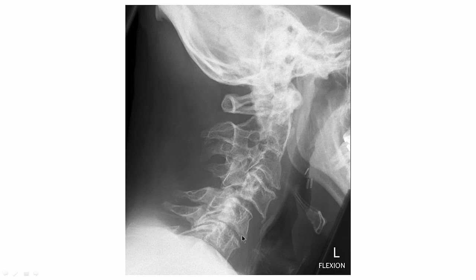Let's do the anterior longitudinal line. So that would be running up smoothly. Oops, what happened here? That doesn't look very smooth, does it? No, this is way too far forward. This is called the anterolisthesis. You could call it a spondylolisthesis as well. Grade 1, and that's not good in the neck, right? Because the spinal cord sits right back here. This can kill you if it's up this high.